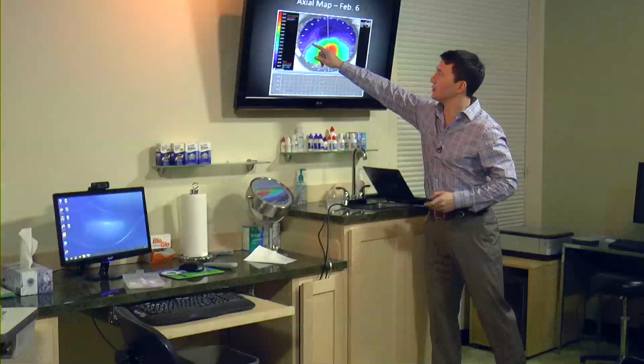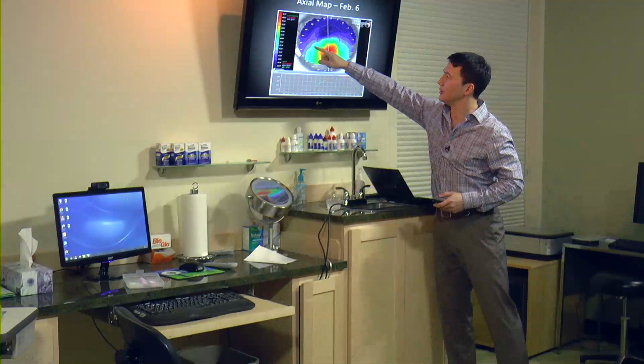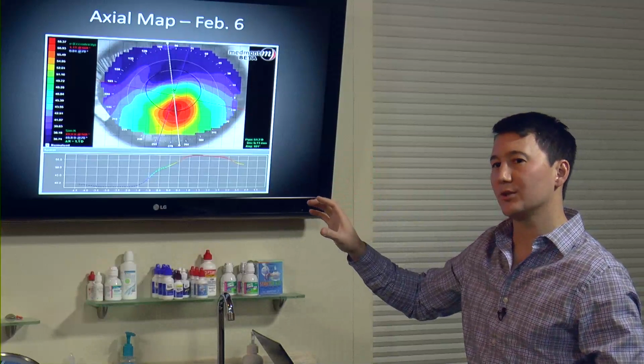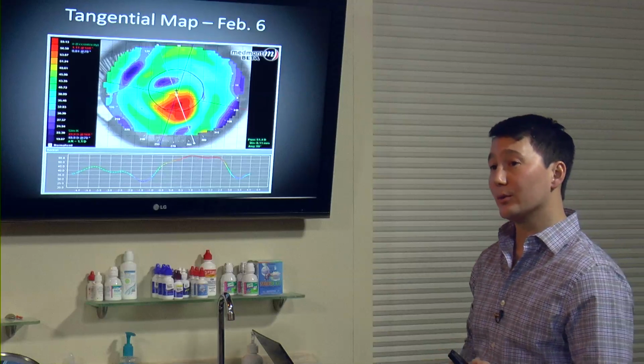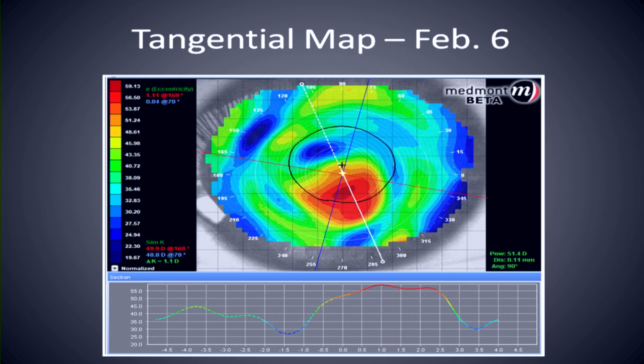And it's this. Even in a keratoconic patient, corneas are smooth. Notice how the rings appear to be pulled a little bit here and here, a little bit in there. So this is where the axial map is not so sensitive. So axial we use for refraction, but if we want to understand if our eye is altering shape, we pull up the tangential. Where do you think that contact lens is positioned? Small, steep lens, fitting right over the cone, kind of locking itself down around the cone, and it becomes immediately obvious where our lens is bearing, where it's positioning as well. Not that we wouldn't see that in the slit lamp, but you can tell from tangential maps how you alter the shape of the eye.